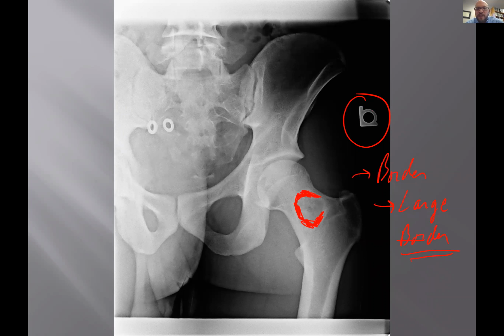Now, let me show you how important a description is. Just tell me your heart on this, guys. Share your heart with me. If something's got a thick border surrounding it like that, does it feel like it's been there a long time or a short period of time?